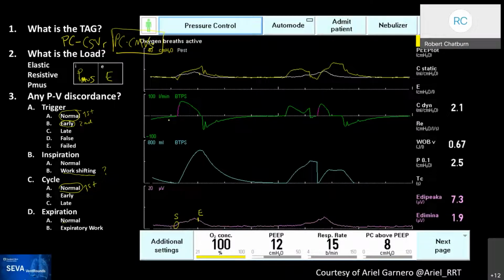So we talked about this first, the trigger. I think the trigger, you can see actually how synchronous it is. It's pretty good for being a flow trigger. If you had him on NAVA, you would not gain anything here. You probably would gain it on the cycling here. The second one, you identified this beautifully, Samir, in which it's mandatory breath followed by evidence of spontaneous, so from a patient activity.